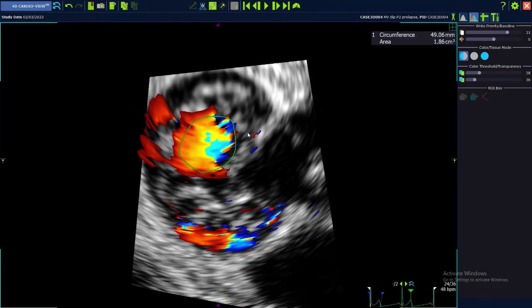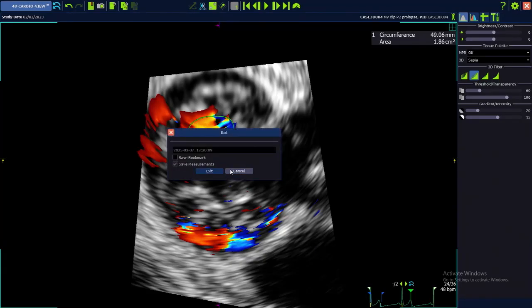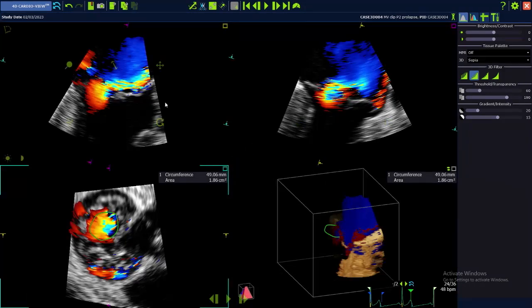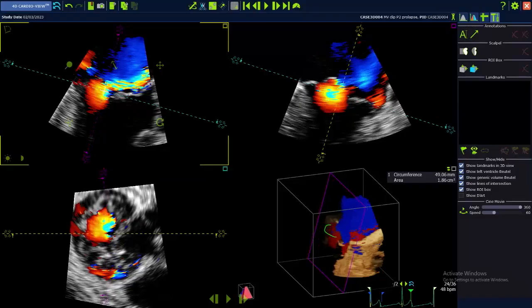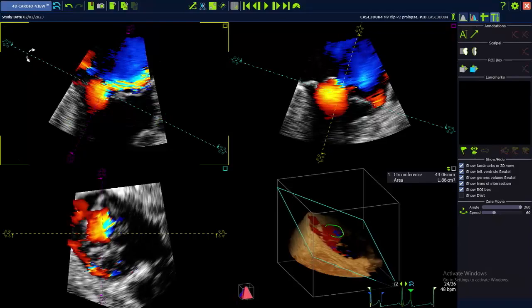And so, do you need assistance? Oh, just, yes. Let me get out of this. Oh, got it. Let me get out here. Let me cancel this. And let me get my planes back on there. Sorry, I took them off. Let's put them back on. Here we go. You're saying this, right? Yep.